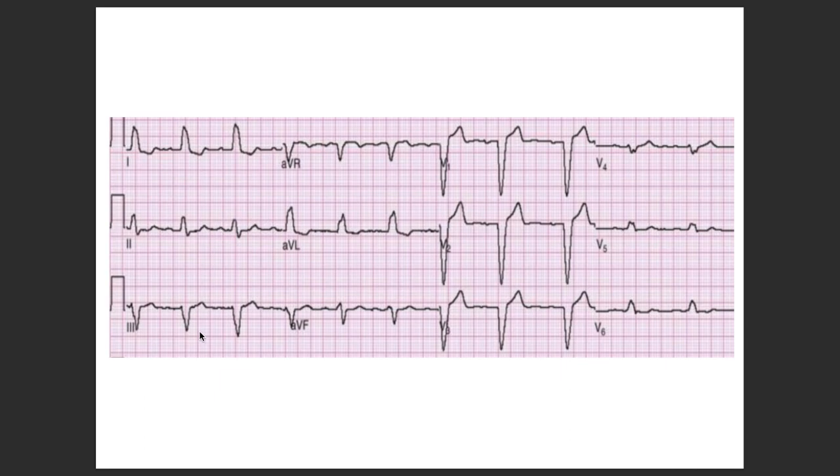So if you try to see in lead 2 as well, are you able to see P waves or not? Yes. So is this a sinus beat or not a sinus beat? Sinus. Wonderful. See, you all are so intelligent. Okay, so we see a P, there's a QRS, there's a T wave as well. So definitely this is a sinus rhythm. Now we know the rate as well, okay? So there's no bradycardia, it's not a tachycardia. This is in good rhythm, in fact.